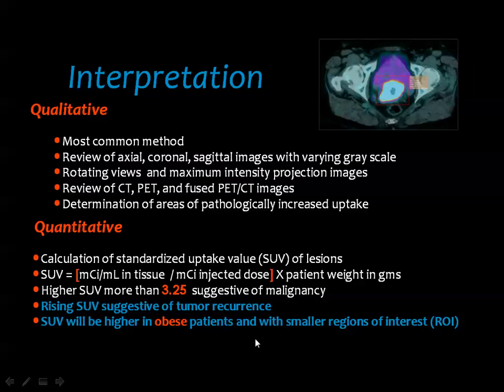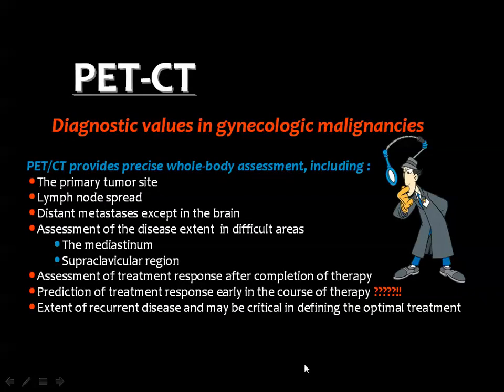And the threshold for the standard uptake value is about 3.25, which can suggest malignancy, and this is liable to many errors, as you know.